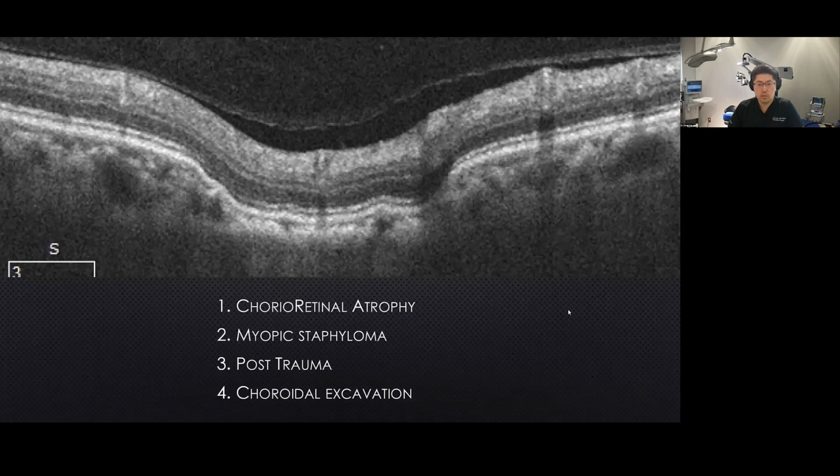And finally, what is the diagnosis of this? And also think to yourself how you would describe this OCT finding. And as we're doing the poll, I just want to bring everyone's attention to the fact that as an ophthalmologist or eye care professional, we're very privileged to have access to the various imaging modalities, making us almost our own radiologists.